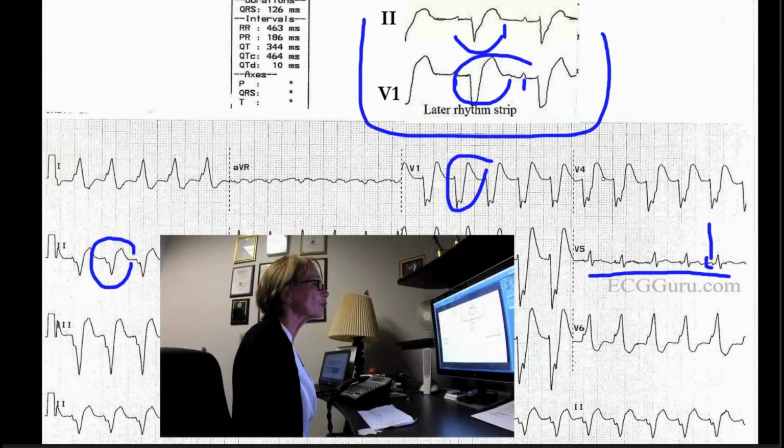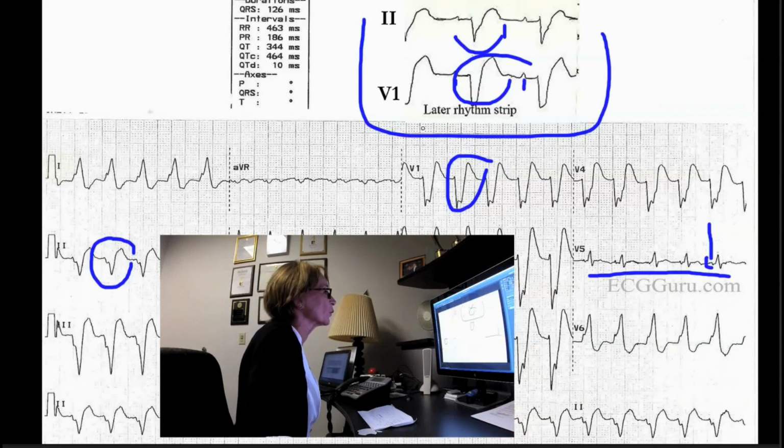So the conclusion could be that they were always in a left bundle branch block because the QRSs didn't change, and this never was a VTach. But that's all right. They were treated appropriately, and things turned out okay. There is a little bit of an issue with wide complex tachycardia when you have a sinus tachycardia with left bundle branch block or something else causing a wide complex. There's a chance of treating with cardioversion or medicines that aren't needed because it's a sinus tach.